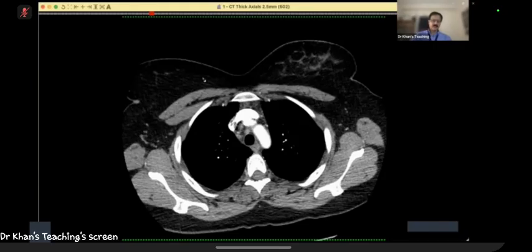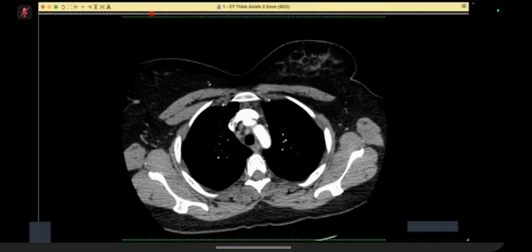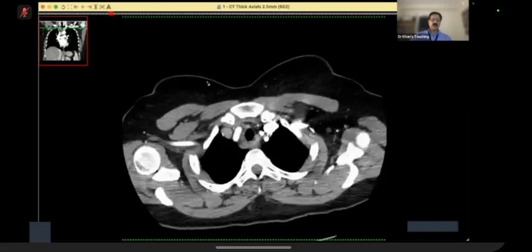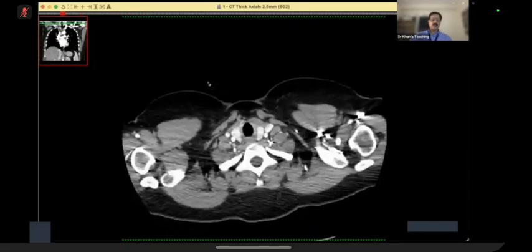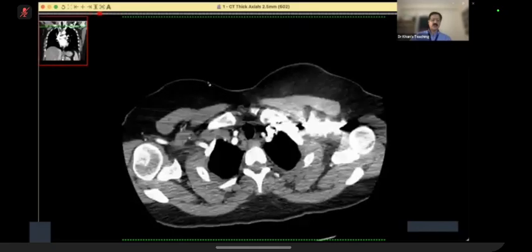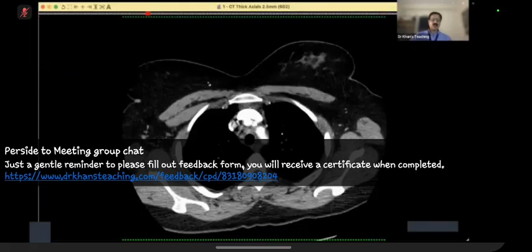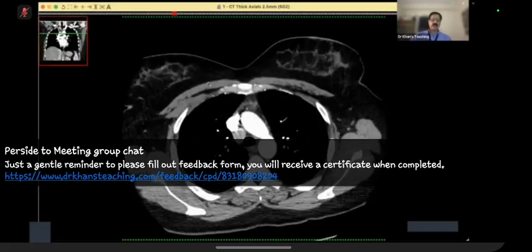Okay? Okay. Can you ask for control? Yes, sir. Can you hear me? Yes, we can hear you. Now I'm going to scroll for you. I want you to just concentrate on the mediastinal window and just concentrate on the mediastinum. I'm going through it.